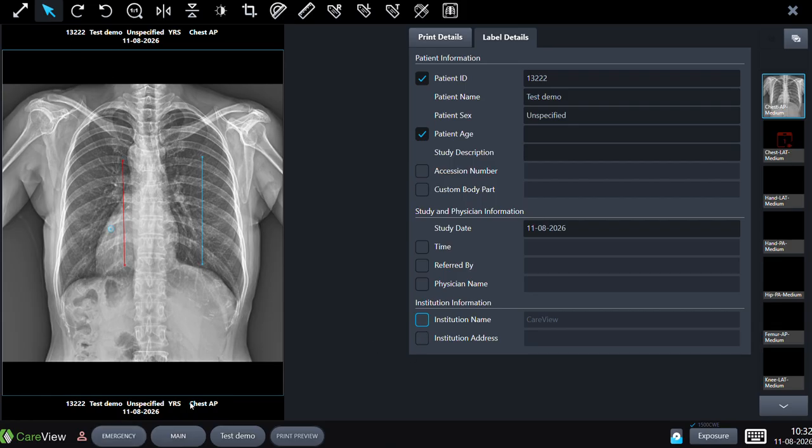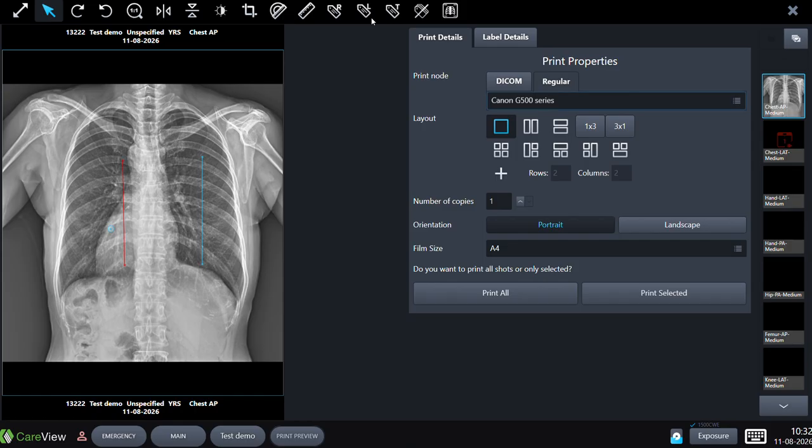Right now, with the settings that I have on my computer, you can see that the image text or the image information is being shown at the bottom and at the top. It can be changed. If you only want it at one of the places, it can be done. If you want it to be on the corners, you can do that as well.